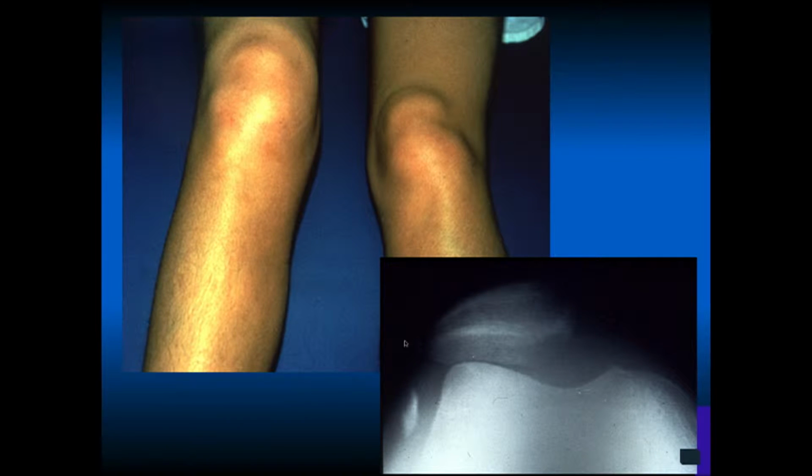So this is what her large hemarthrosis looks like. This is her loose body, which, if you don't get an x-ray back posterior enough, you may miss. This piece started here and is now floating around in her knee. Again, unlikely that it could be fixed since it's been displaced.